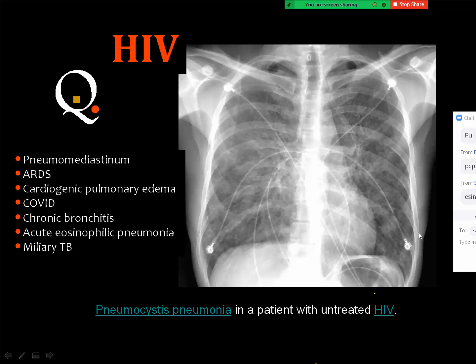Also, sometimes, because of the immune compromise of the patient, why is this lesion not COVID? Actually, we cannot diagnose COVID for sure from the plain film.